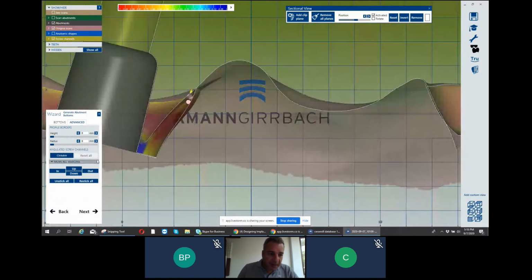In some implants, I cannot reduce the radius to 0. It has to be 0.2. But why do we prefer to reduce it to 0 or to the minimum? Because we don't need to have more pressure on the gingiva inside the mouth. That's why when we minimize the radius, it means we will follow the shape of the implant at the bone level to avoid any pressure on the gingiva when we need to fix our abutment.